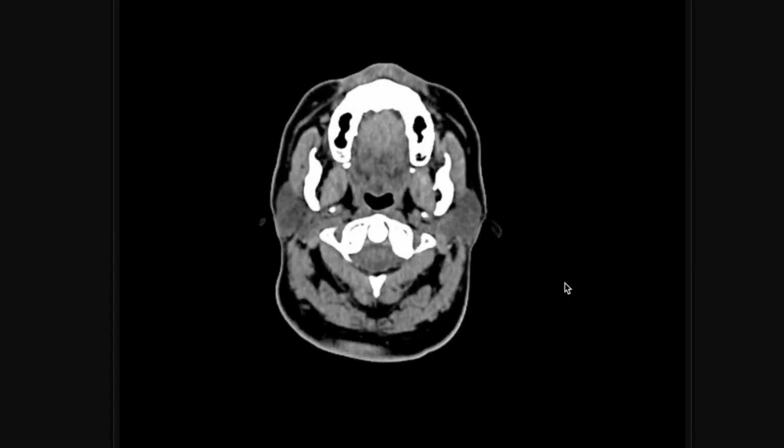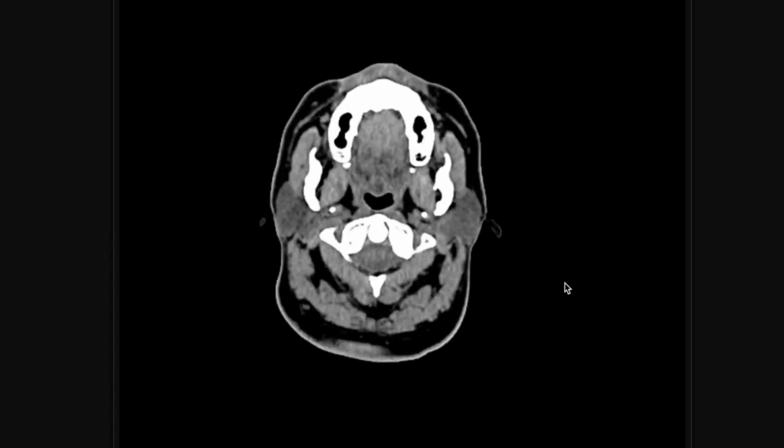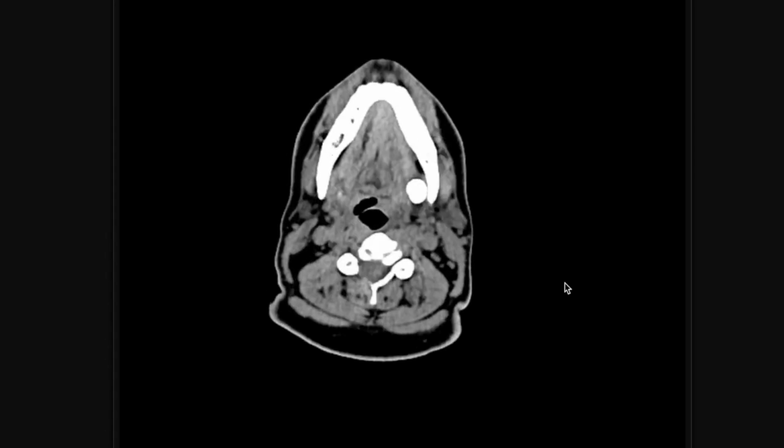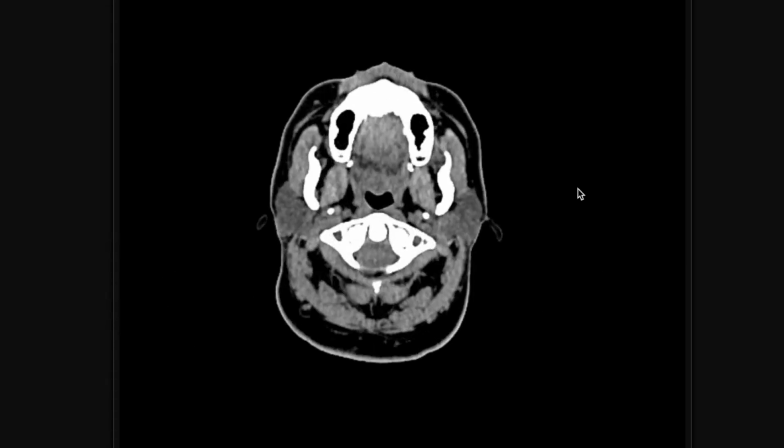So I have a very interesting case of a 50-year-old male who was referred to the CT department upon complaining of left mandibular pain during deglutition, and specifically on the lower left side. I will give you a few seconds to determine the radiographic findings in this following CT.